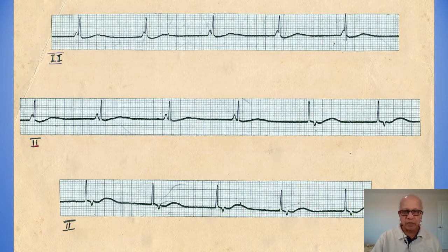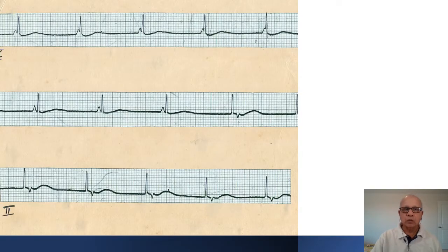That is the treatment. Now, this arrhythmia, what you see here, is a regular narrow QRS arrhythmia, isn't it? But it is slow. So where is it arising from? If you look carefully at the narrow QRS complexes, this arrhythmia, because of the narrow QRS, is coming from above the bifurcation of the bundle of His.